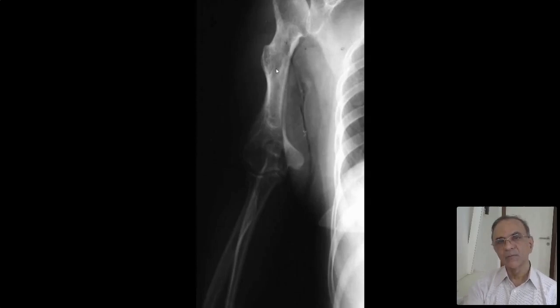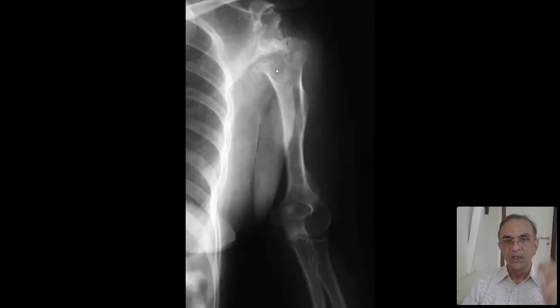So this is an abnormal bone; bone growing out of bone is diaphyseal aclasis. Why is the difference so important? Because in diaphyseal aclasis, the chance of an osteochondroma becoming a chondrosarcoma is about 20%, and it's extremely sporadic in an isolated osteochondroma. So it's important to know that this is diaphyseal aclasis. This is a spot diagnosis. This is what I was talking about as Aunt Minnie or gestalt diagnosis.